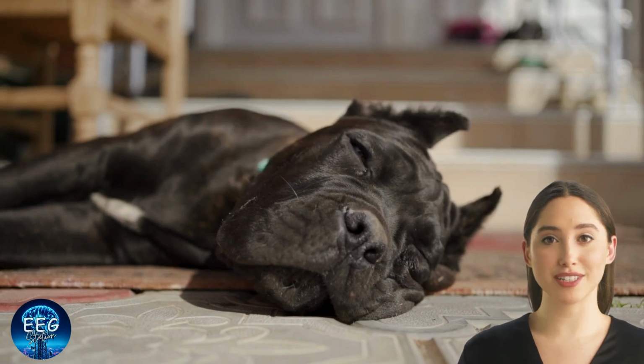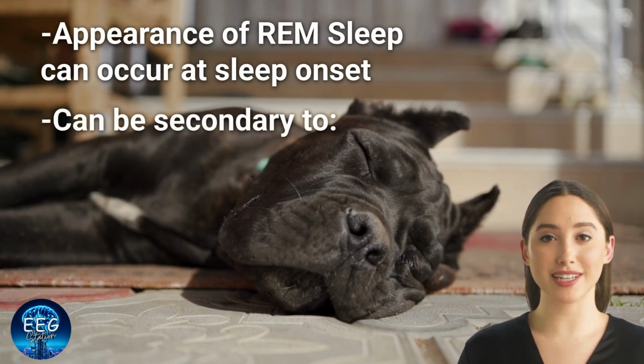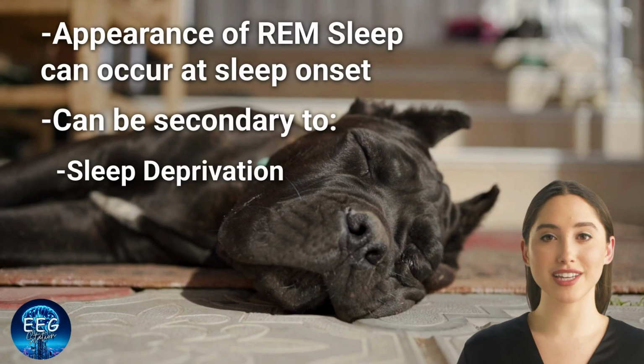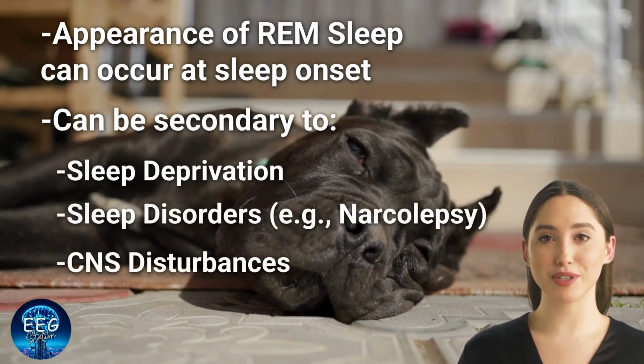However, the appearance of REM sleep at onset of sleep does occur and can be secondary to a sleep-deprived patient, sleep disorders such as narcolepsy and sleep paralysis, or disturbances of the central nervous system.